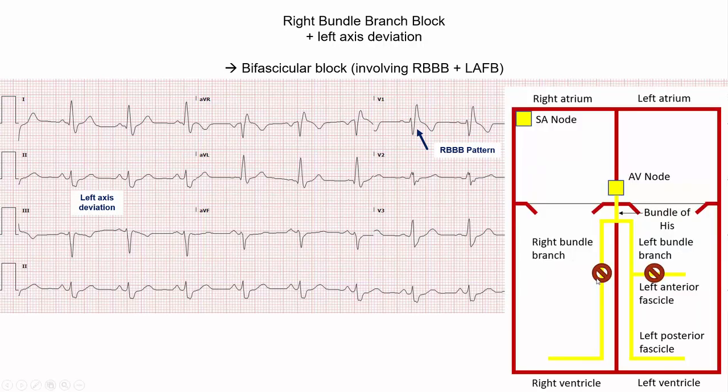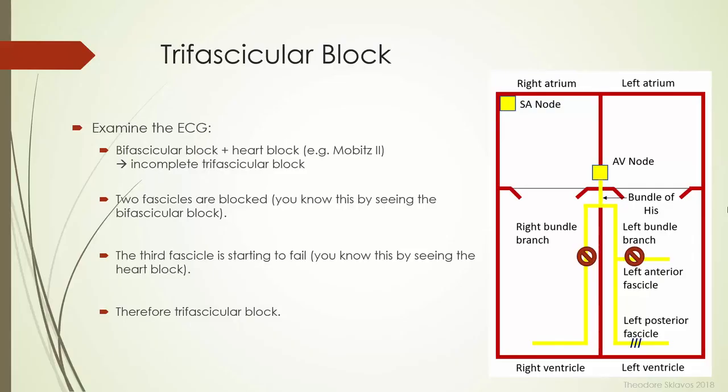So here it is on the diagram. These two fascicles are blocked. Okay, let's add one last detail, and let's talk about trifascicular block.